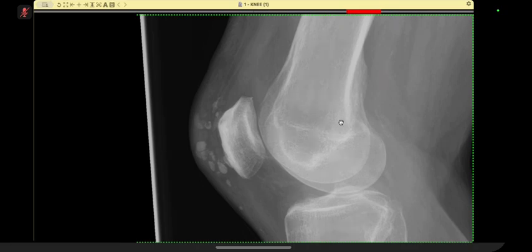So give me a conclusion for this. What is this calcification? I'm interested in the calcification. Sir, these calcifications are noted in the prepatellar area within the soft tissues, with no adjacent cortical lesion noted in the patella. I'm thinking that this is a long-standing etiology, maybe a chronic inflammation such as bursitis.